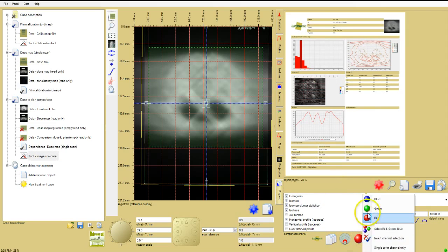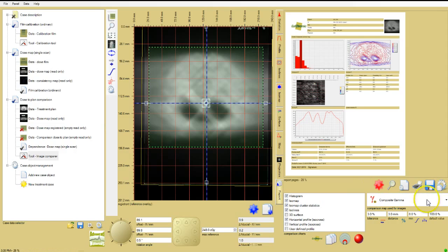If you've customized any of the charts in the report, click on the icon at the far right of the section. And if you changed any chart after specifying the contents and layout of the report, click the big red star to update.